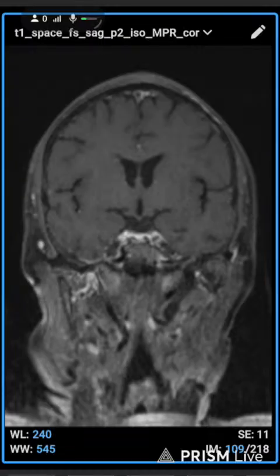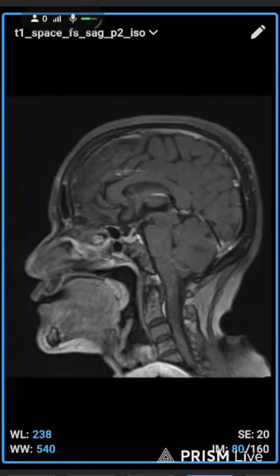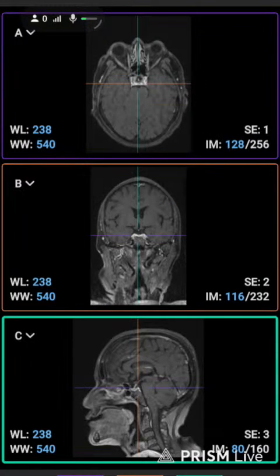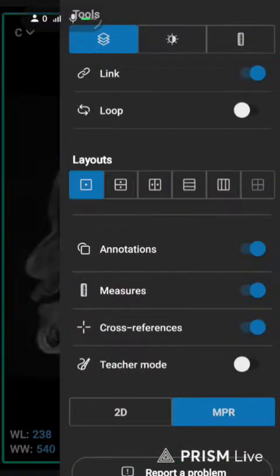So we get back to the, I don't know what is happening. When I convert the image, it goes flip. Yeah, right now it's okay.